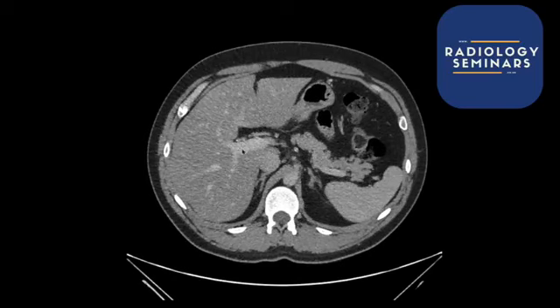You can see that it's slightly more dense in the portal vein. So this is the portal vein that's going into the liver. And because it's slightly more dense than the aorta, you'd be pretty safe to say that this is a portovenous phase. And the portovenous phase is very useful when you're looking at CT scans. It's almost a go-to phase when we're doing acute studies.